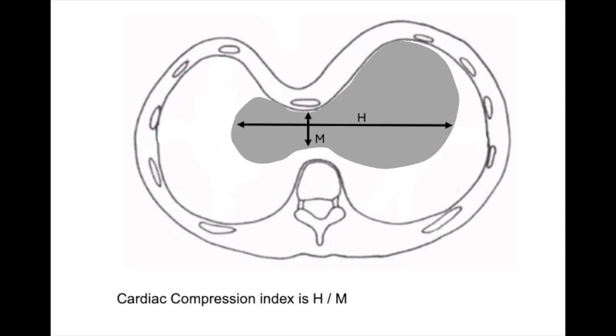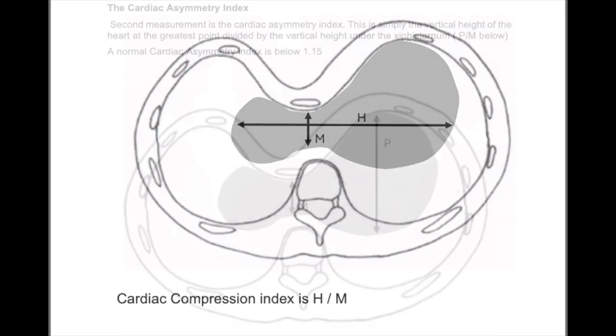It's cardiac tissue. Also, as we are going to show, you should really have at least 1/3 of the atrium in this measurement, because sometimes hearts are so squashed across, they're actually not even under the sternum. So we do need to move this measurement across to have some of the heart in it. And we're recommending at least 1/3 of the atrium in it.